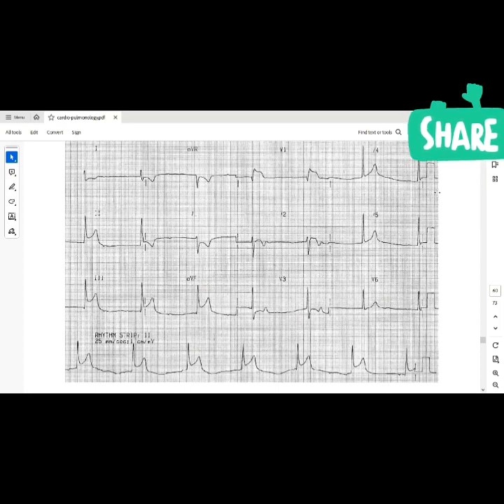Is there a certain lead you want me to focus on? You're supposed to read all of them, so you read all of them in sequence, looking for those changes we just talked about.